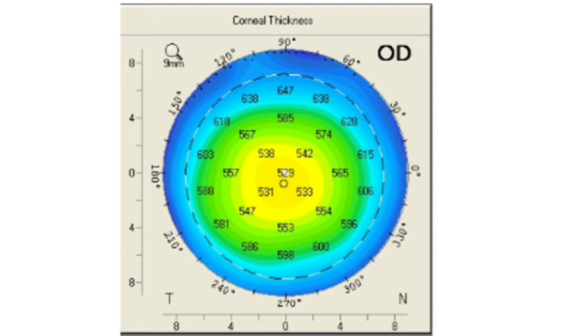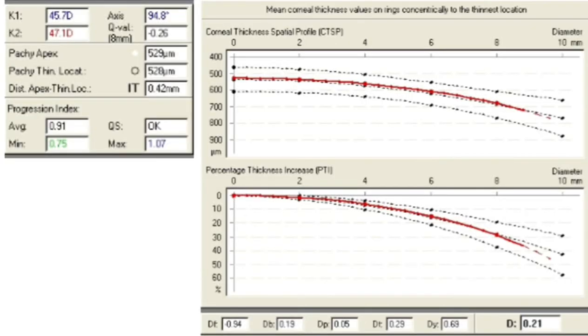In the coming example, we are going to observe some abnormal condition where this variation or this difference is very much high, then only you can understand, okay.